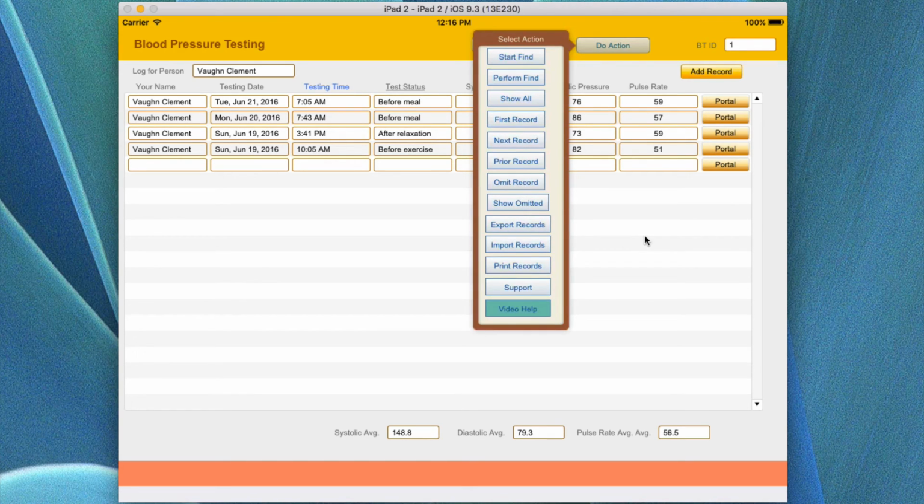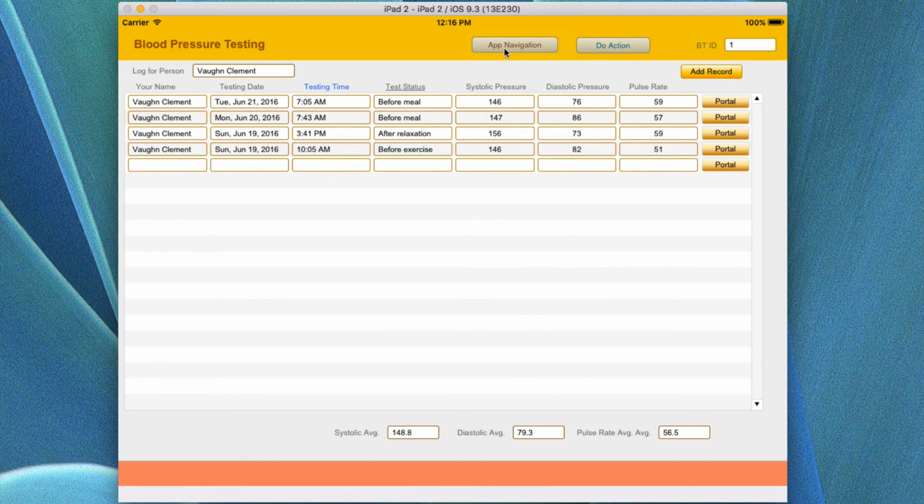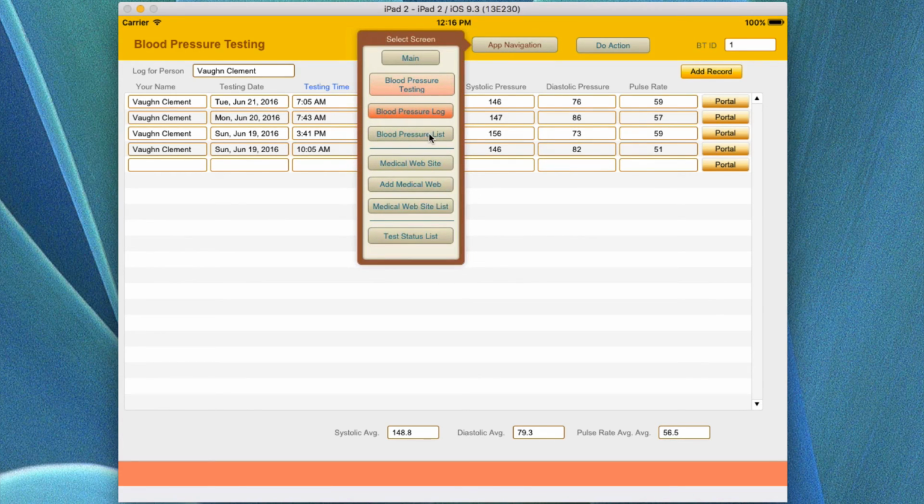So let's go ahead and stop now, and then we're going to come back and we're going to navigate from here to the blood pressure list view and then do some individual items on that list, on that tutorial.